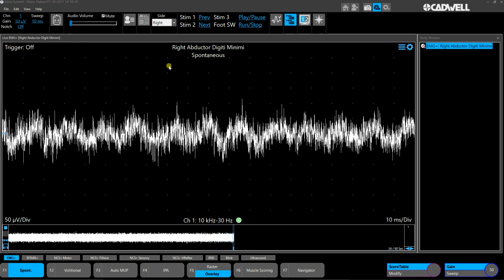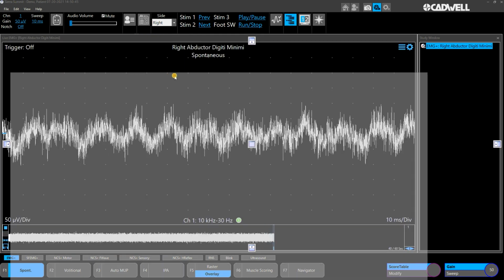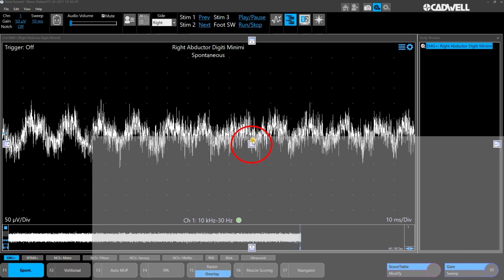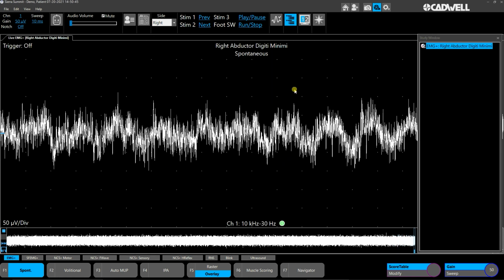And then just grab the main window of the workspace, like this one, for example. It doesn't really matter which one you call the main one, but I'm going to click it. You'll notice it's floating and it drags around. In this first window, I'm going to drag it right into the center of the screen and drop it into this little icon here.